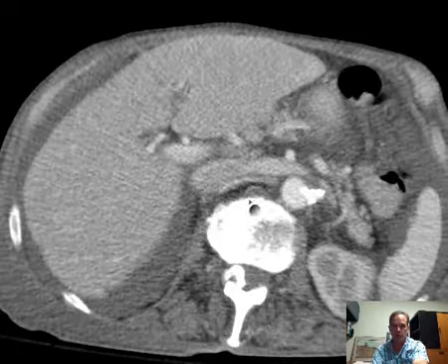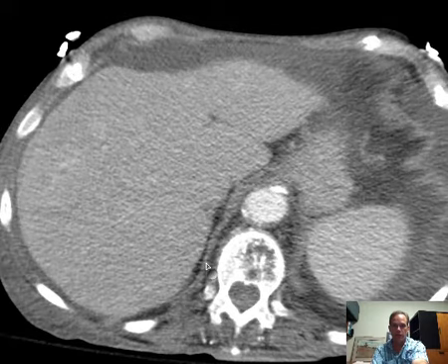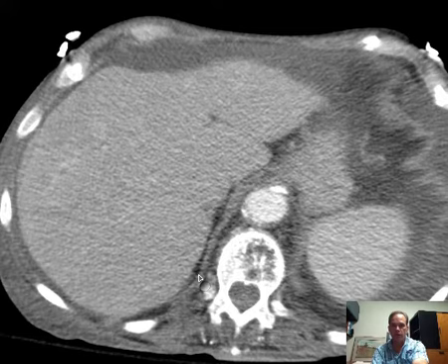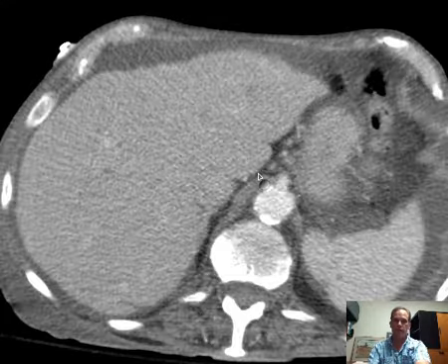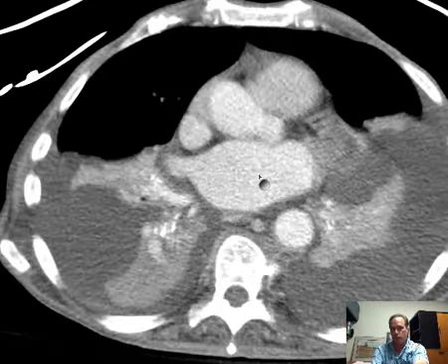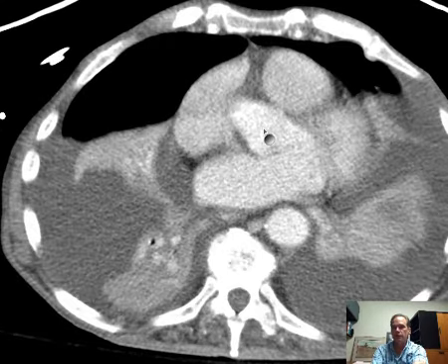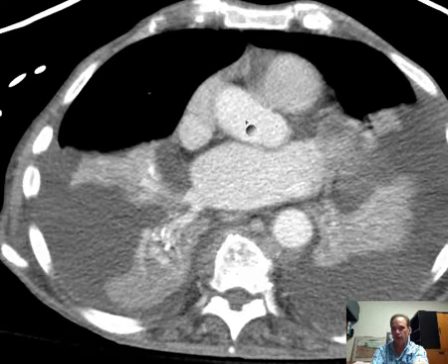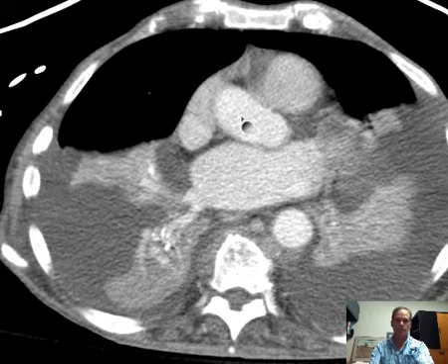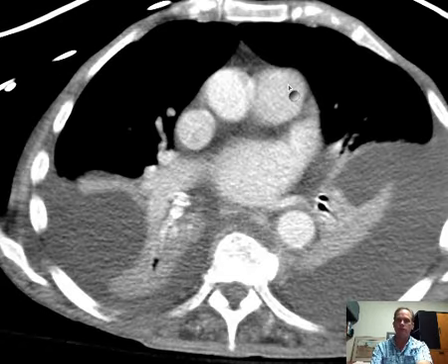So here then you see an abdominal aorta. And these little structures here actually are the crura of the diaphragm, the anchoring part of the diaphragm where it inserts into the posterior structures. Okay, so this is the thoracic aorta. You have that idea. Now look closely here at the ascending aorta, as it comes out of the heart. And it has a big neighbor right anterior to it. That is the pulmonary artery.